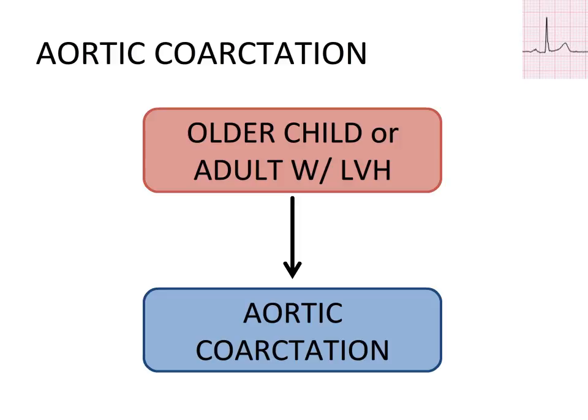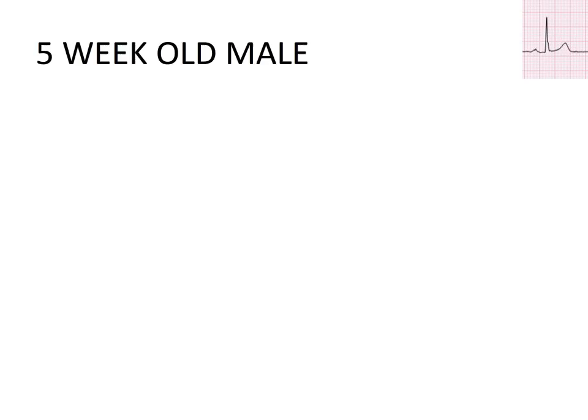Remember that not all patients with right or left ventricular hypertrophy have aortic coarctation, but in the correct clinical scenario, this should be on your differential. Okay, let's go back to our case one more time.